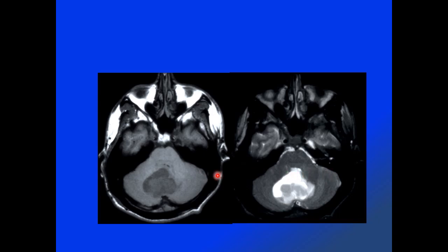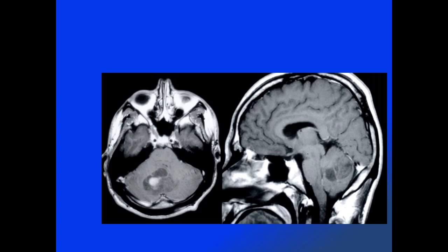T1 and T2A images demonstrate a different mass within the posterior fossa in the midline involving the posterior wall of the fourth ventricle with extension into the medial cerebellar hemispheres bilaterally with slightly heterogeneous enhancement pattern, with most of the mass within the cerebellar hemisphere in this adult patient, again representing a medulloblastoma.